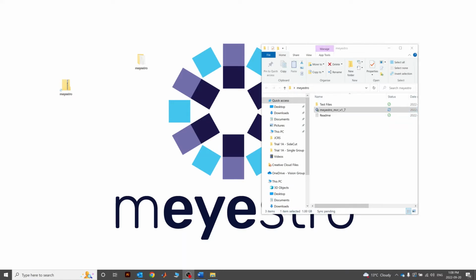Once you're ready to install mEYEstro, please double-click on the executable file. Depending on your computer power, this may take a while to open, up to 30 seconds, 40 seconds. If you are prompted by a window to approve the installation, click on Yes. It won't be too long before the installer starts.